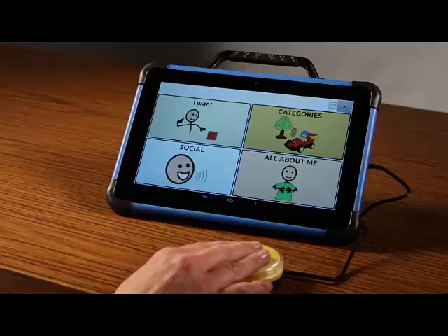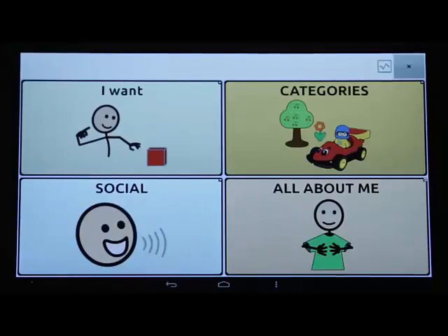The vocabulary scanning pattern will also impact how the magnification appears. For example, in block scanning, if the magnification is large, the group of buttons will be stacked. It is possible to magnify to fill the entire screen with one button. This example will be with 4 Basic and a linear pattern.